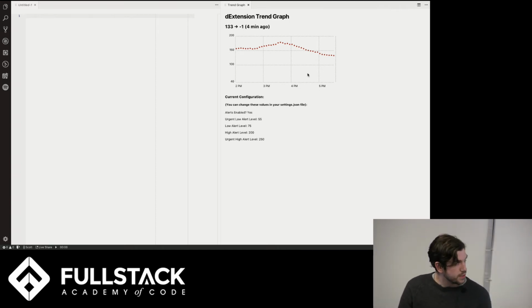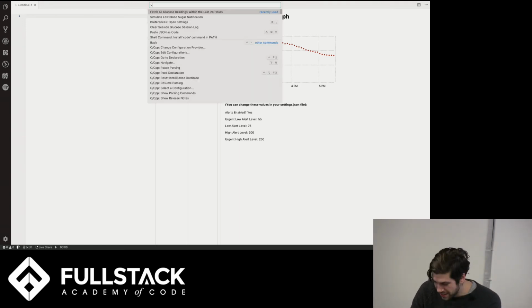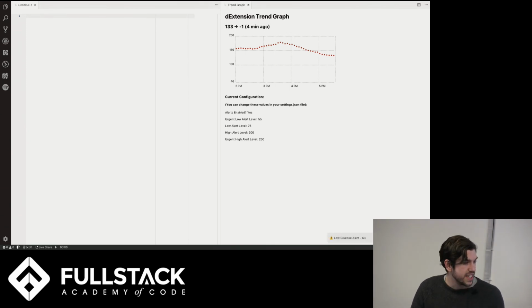This data is live, by the way. This is my actual blood sugar at this very moment. So if it were to go out of range, you would see a pop-up in that corner. And I just ate 20 donuts in the bathroom, so any minute now. Give it 10 minutes. No, I'm just kidding. I made a simulation. So you get a nice little pop-up like that, and it's pretty handy to see.